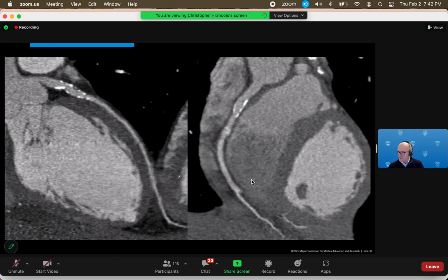So this is a patient that has atherosclerotic coronary artery aneurysms. Okay. And if this patient was 15 years old, this would be Kawasaki's disease. In a 65-year-old or 75-year-old, it's atherosclerotic disease. Okay.